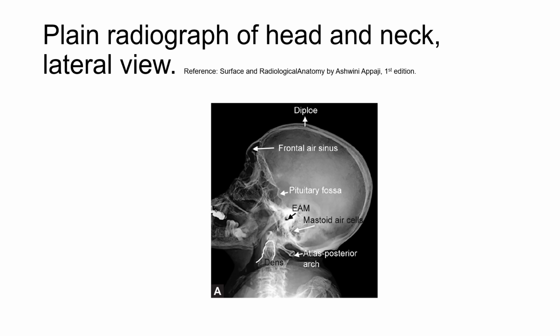Then the neck is tilted. However, it depends on the radiologist how he wants it, and in general the neck will be tilted in this situation. Then the orbital opening will be facing up. They can also take an X-ray in which the face is horizontal, meaning the neck is not tilted. That depends on the radiologist and according to the condition of the patient what we need.